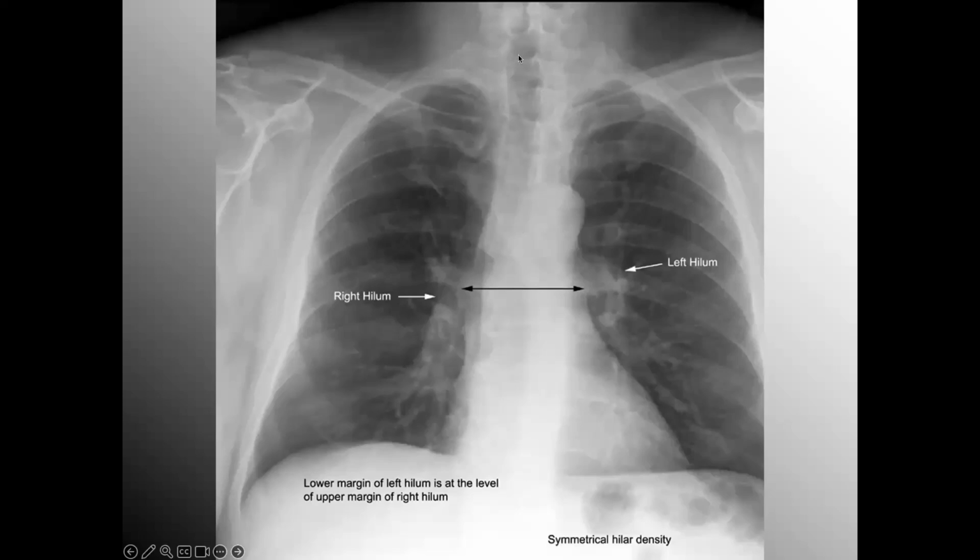We have the trachea, which is slightly offset, just ever so slightly towards the patient's right. These are my spinous processes. I can see what are sometimes affectionately called the wings. This is the widest transverse process of the thoracic spine, T1. And so that would be my spinous process of T1. So 1, 2, 3, 4, we get down to 5, and here we are. There's the carina in the adult.